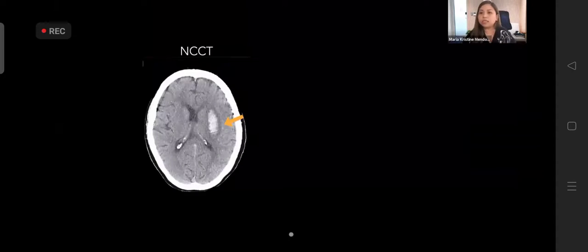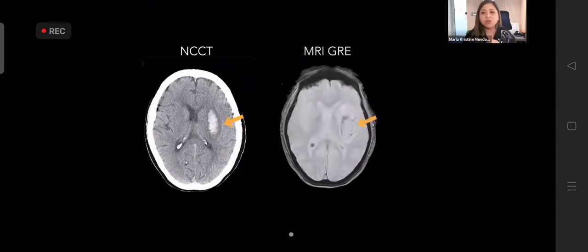Dr. Lagamayo would be discussing intracranial hemorrhage in depth, but just to give you a brief overview of how intracranial hemorrhage would look like, because again, this is the first thing that we would want to exclude in suspected ischemic stroke patients, because it is an absolute contraindication to thrombolysis. So for non-contrast CT, as I have mentioned, it would appear hyperdense or white in the brain parenchyma.